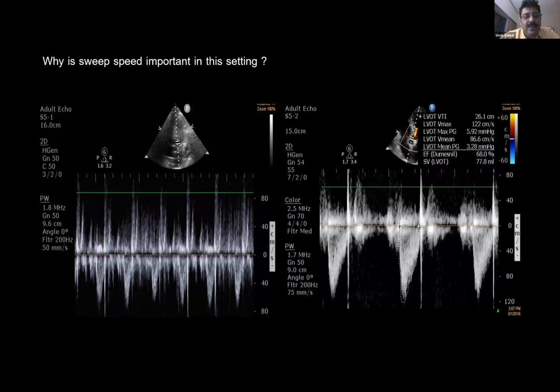The reason I'm showing you this is, don't jump and give fluids if you are seeing this. In every patient of right heart failure, you will find that there is an increase in swings, which is known as a false positive stroke volume variation on echo or on Vigileo, or a false positive pulse pressure variation, as you will see on an arterial line.